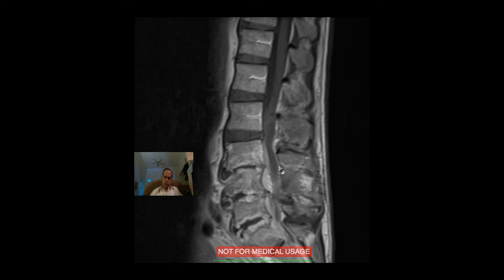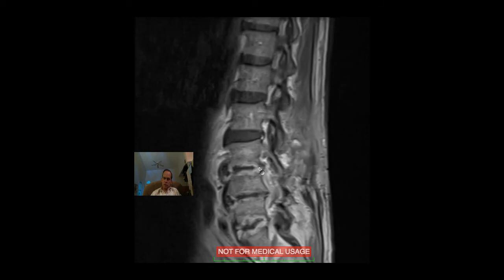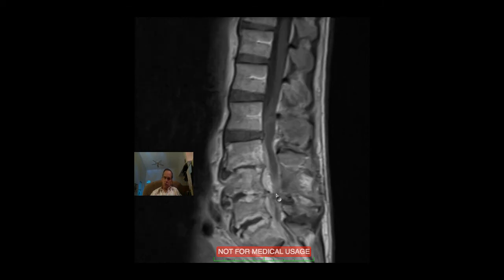But you can see very clearly here a dramatic demonstration of central canal stenosis due to L3-4 and L4-5 disc degeneration, inflammatory changes that probably reflect an earlier infection, and a narrowed canal that is considerably smaller, even at its maximum, compared with the more normal upper lumbar spine.